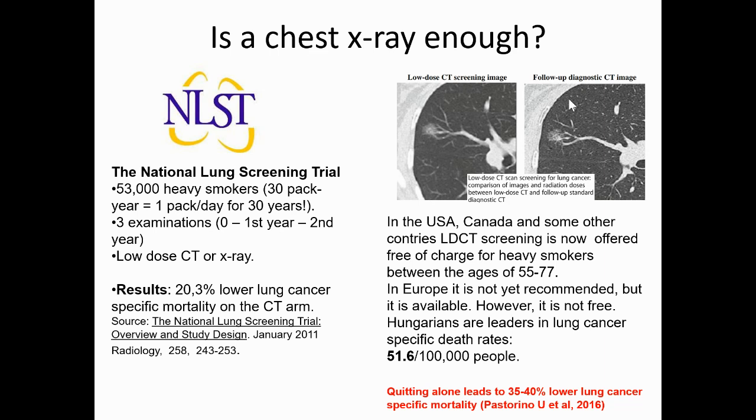Here are 2 images showing you the difference in image quality. The diagnostic CT image utilizes about 7 to 8 millisieverts of radiation, and it shows the vessels in great detail and the bones, etc. in better detail than the low-dose CT image. The low-dose CT image utilizes about 1 to 2 millisieverts, but it's still diagnostic because you can still see this nodule over here, which is quite suspicious for cancer.